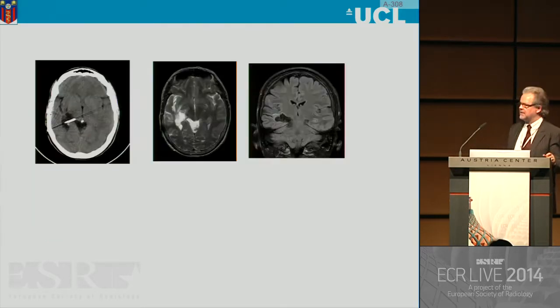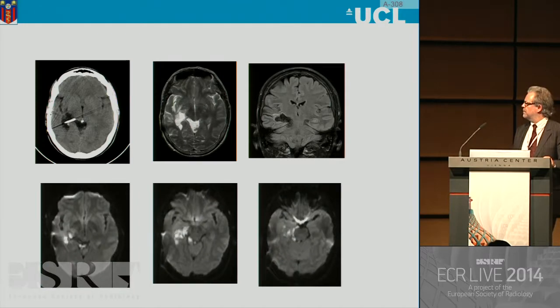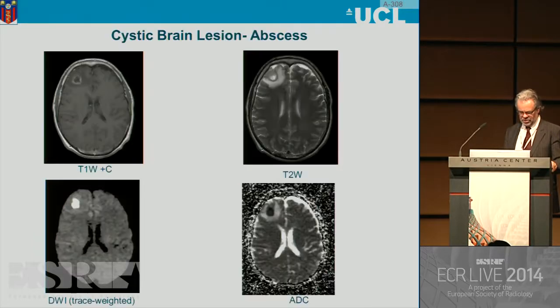This is a recent case last week presented at our neuro-oncology meeting. A patient referred to the neurosurgeons. They've been trying to shunt this cyst. The patient had some nondescript symptoms. They didn't know and they couldn't drain it and nothing happened. And nobody ever had thought of doing a diffusion-weighted image. Diffusion-weighted image is, yes, of course it doesn't drain. It's an epidermoid cyst. Don't waste your time. So this is really practically very important for the differential diagnosis.